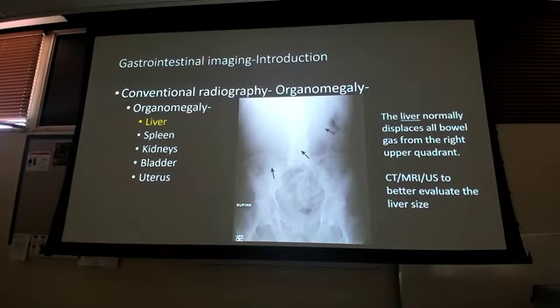So you will get better practice at that the more you look at these x-rays in clinical and things like that. If I give you an organomegaly one, I'm probably going to try to find you one that looks a little bit more like this, okay? This is more of a direct visualization. Now, we will talk about the Riedel lobe and the normal variant thing here in just a second, but look at my liver coming all the way down, right? That's all the way down into that iliac area. The liver coming past the 12th rib, normal. Even coming down here, I'm probably not too concerned. If I'm infringing on the iliac crest, that is hepatomegaly, right?